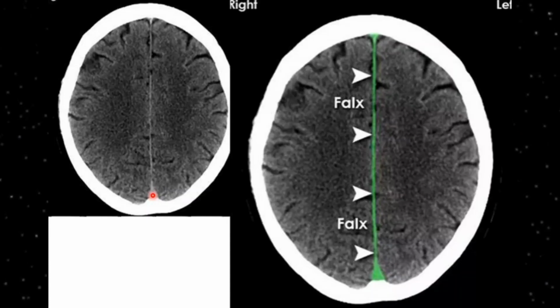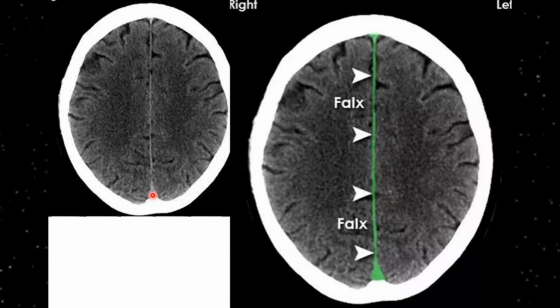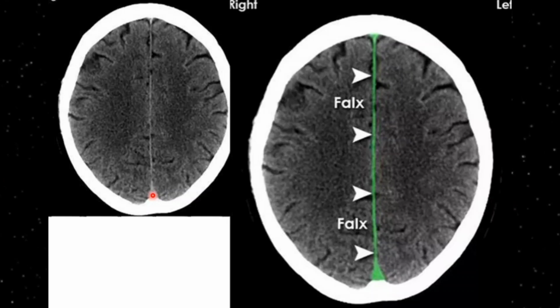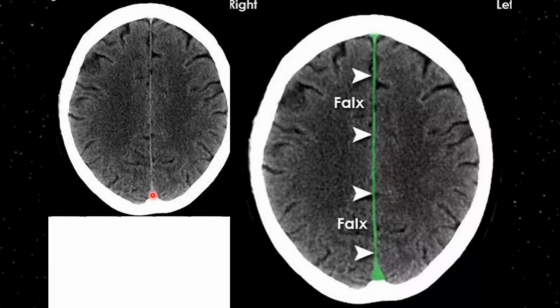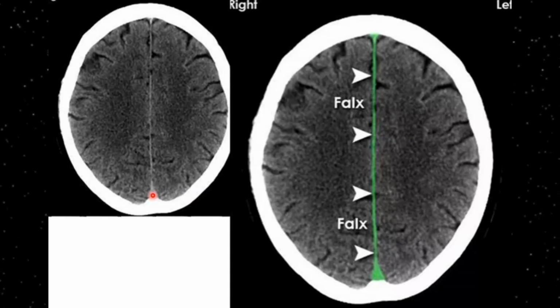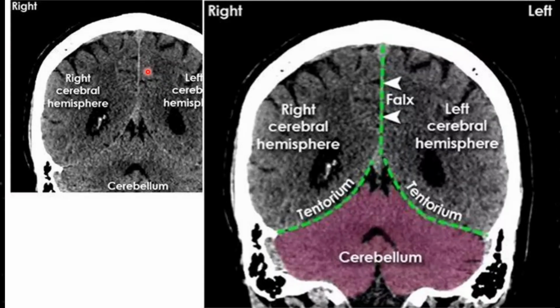Now this is the slice where the ventricles are over, and in the image you can appreciate the fibrous tissue line which appears white on the normal CT images and has been shown green on the other image. This is actually the falx cerebri. It is a very thick, very strong septum, and it is responsible for preventing the brain from excessive movements. Now on this image we are going to discuss the coronal image reconstruction.